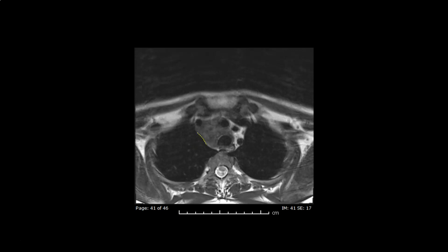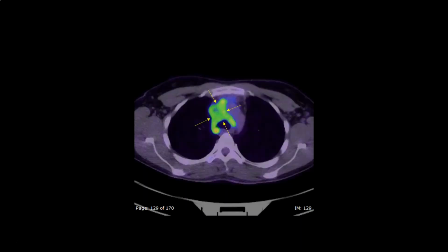A third feature of fibrous tissue is the concave outline of the lesion, due to the retractile nature of the fibrous tissue, unlike other expanding tissue, such as, for example, lymphoma, since we are talking about the mediastinum. PET-CT showed intense uptake of FDG, denoting a very hypermetabolic lesion, which is still showing this retractile nature that results in its concave outline on all sides without displacing the surrounding organs, soft as they are.